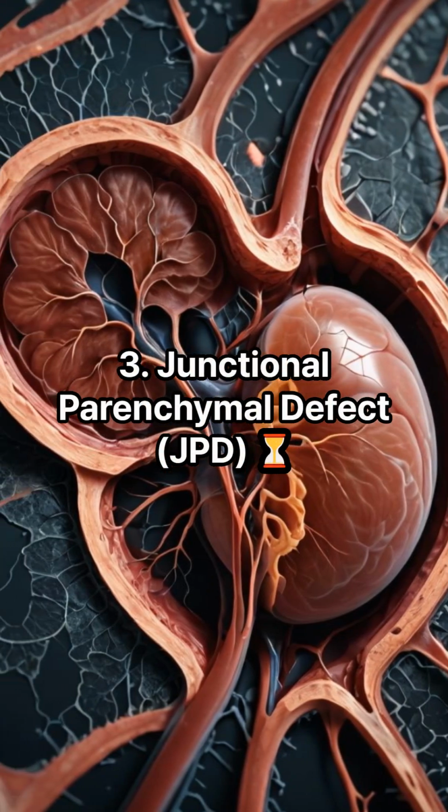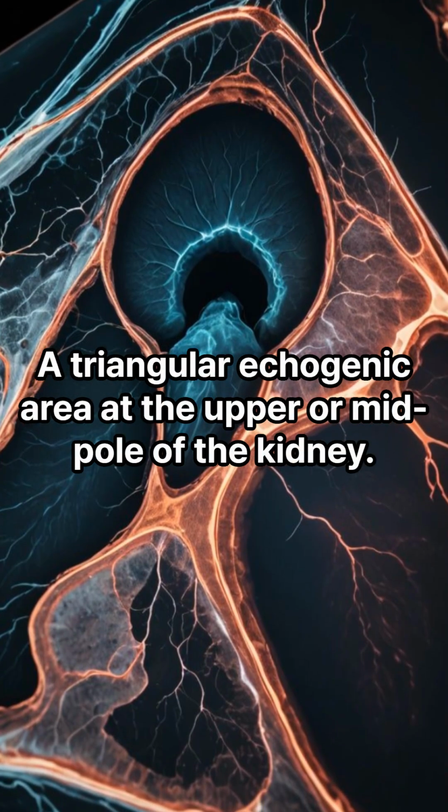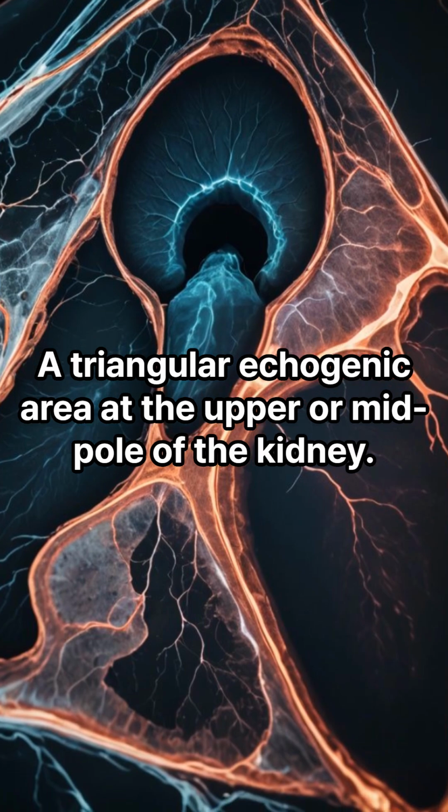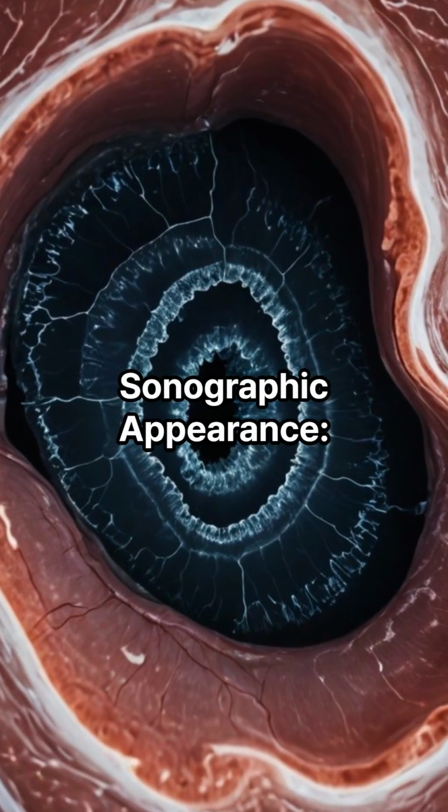3. Junctional parenchymal defect, JPD. What is it? A triangular echogenic area at the upper or mid-pole of the kidney, caused by incomplete fusion of the fetal lobes.